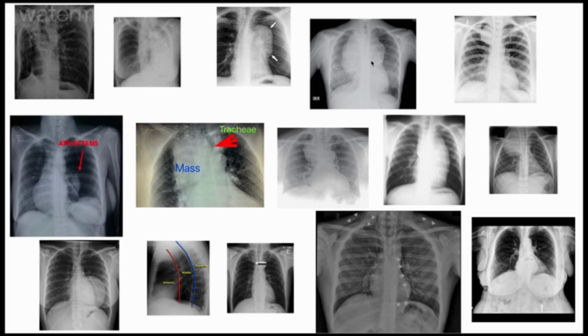This location, the CT scan has made this very easy, but still on a radiograph you can quickly tell where it lies. In this image, we see a positive cervicothoracic sign. The cervicothoracic sign is positive, whereby we have the lesion going above the clavicle. Once that happens, it helps us to locate the lesion. In this case, the location is in the posterior mediastinum.